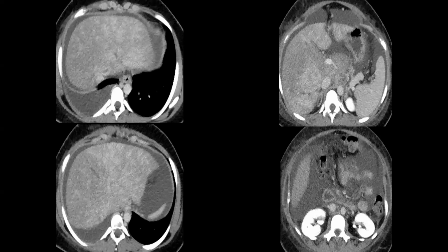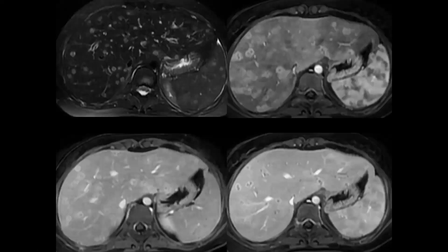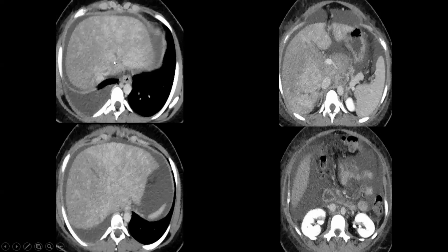A patient came with right upper quadrant pain and abdominal distension. Imaging shows the liver is enlarged. Let me go back to the previous image. You can see this in the MRI. You can see the hepatic veins enhancing clearly. Here's the middle hepatic vein, left hepatic vein, and right hepatic vein. They are enhancing very nicely. If you go to this image, at the area of the hepatic veins, you can see this tubular hypodense structure, which represents a thrombosed vein.